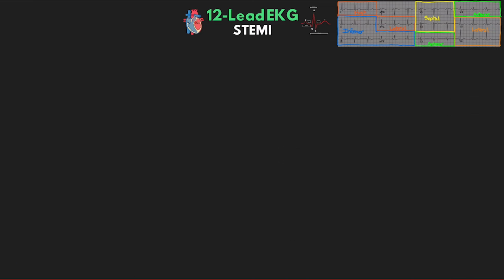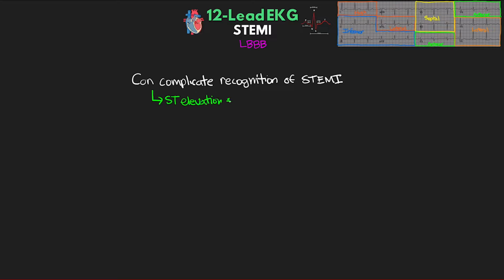All right, and then finally, the last thing I want to cover quickly here is left bundle branch block. So left bundle branch block holds a special place when it comes to MI. First, it can complicate the recognition of STEMI, as a left bundle branch block can produce ST elevation and T wave changes that are pathologically normal for these patients. That can either give the false impression of a STEMI or actually mask a STEMI that's taking place.